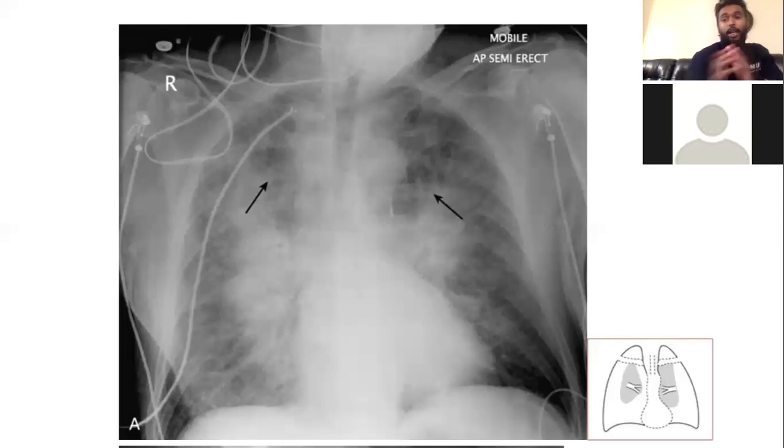So with pulmonary edema related to congestive heart failure, you're also going to see left ventricular dilation of the heart, like this area. So the heart's also going to be enlarged. Not only are you going to see the lung signs, but the heart's also going to appear big, especially the left ventricle. You see here, the left ventricle normally doesn't go that far out. But why do you think the bat sign happens though?